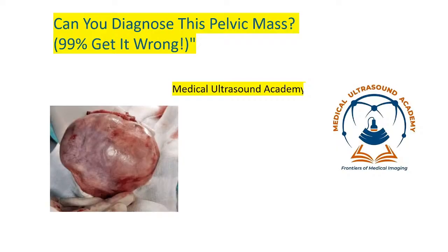So let's discuss the quiz video questions that I gave you yesterday, in which I said, can you diagnose this pelvic mass? 99% get it wrong. So I want you to listen very carefully as we dissect each question. Don't miss any part of this, because it's going to help you improve your vocabulary of pelvic pathologies.